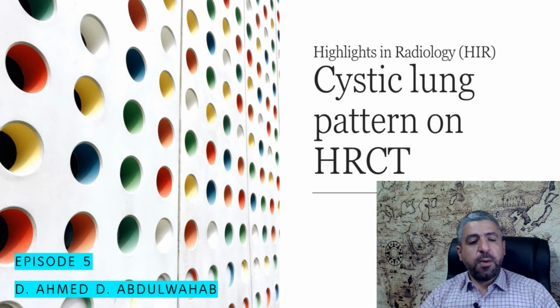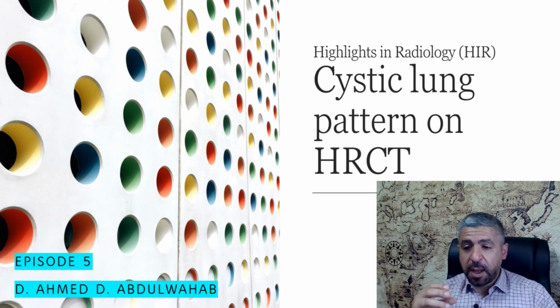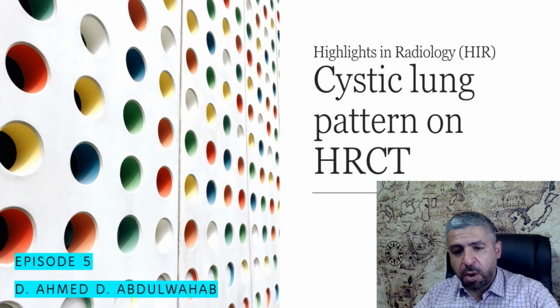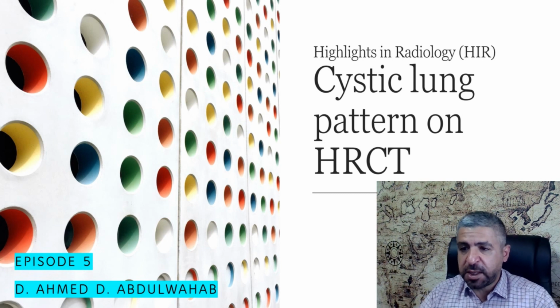Okay, so today we're going to talk about the cystic lung pattern on high resolution CT scan. And when we say cystic, we mean air cyst, not soft or fluid-filled cyst or soft tissue density cyst. So, air cyst lung pattern on HRCT. If you see this appearance, what could it be?